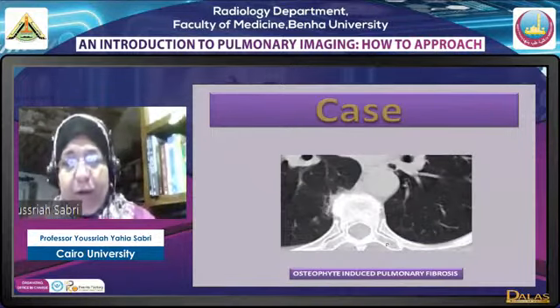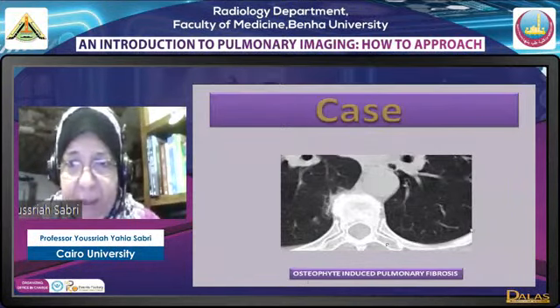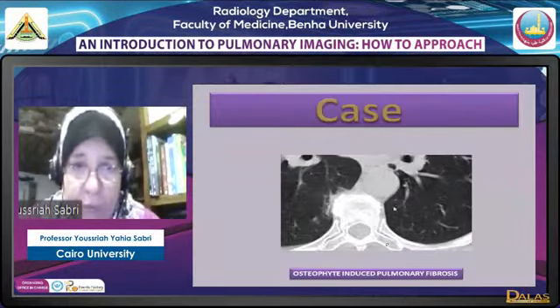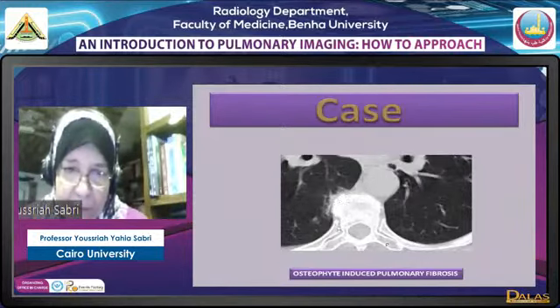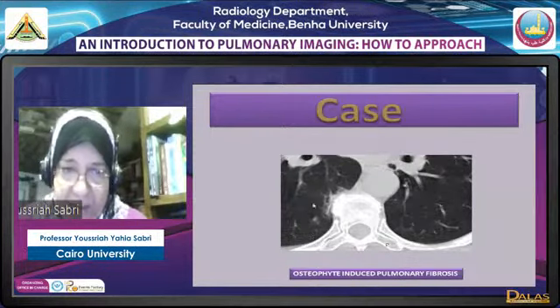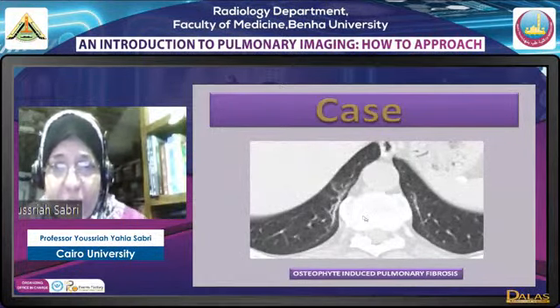Now this osteophyte-induced pulmonary fibrosis we have met a lot lately, and many people get mixed up in cases of diagnosing COVID. We see here this ground glass opacification or reticulation related actually to the osteophyte. So it's an osteophyte-induced pulmonary fibrosis. It is usually seen on the right side, but sometimes we see it bilaterally. We don't mix it up with COVID-19 fibrosis.